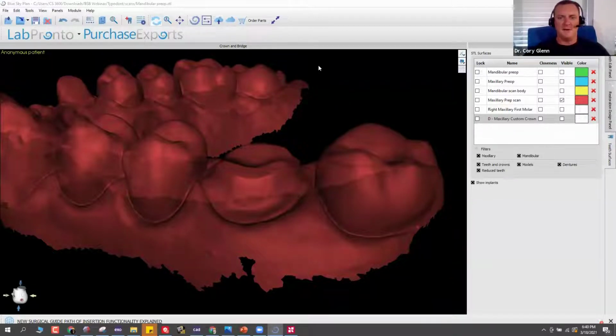Do you have any recommended parameters posted for crowns, printing crowns? Well, I do now because this is about to be online, but really there's not much to remember. It will be somewhat printer dependent. For the printers I'm using, which are very accurate, I use a 0.2 cement spacer, and I take the zero margin thickness down to 0.